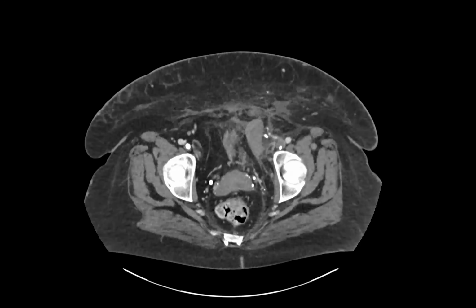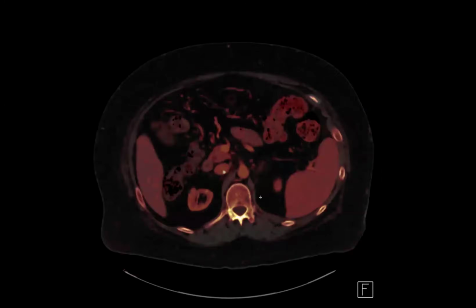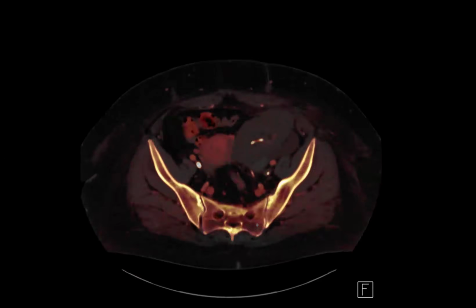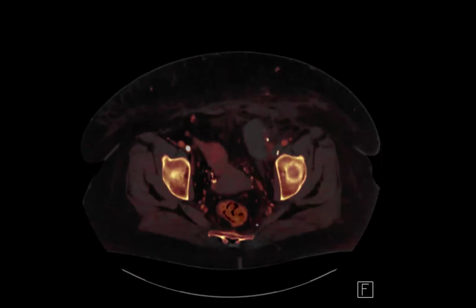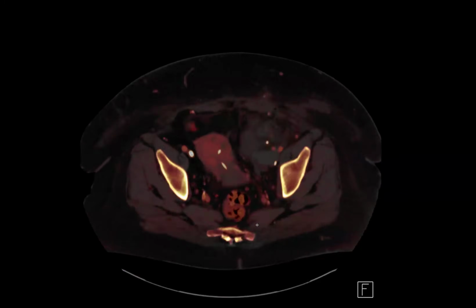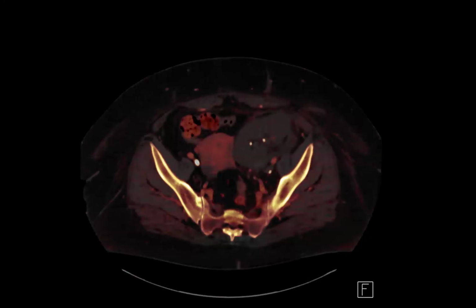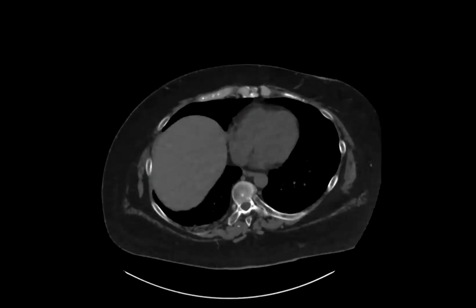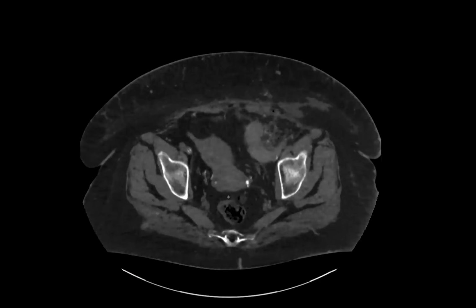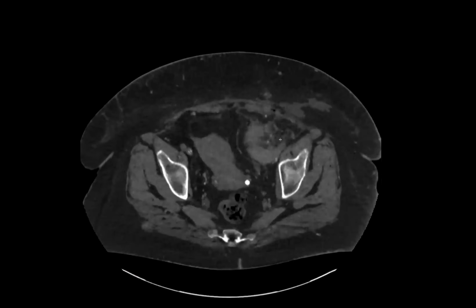And here we did a dual energy. I don't know if this helps or hurts, but here's your devascularized kidney. What is that curvilinear thing? Tell me about that curvilinear thing. Is this the renal vein thrombosis? And here's the virtual non-con. Excellent.